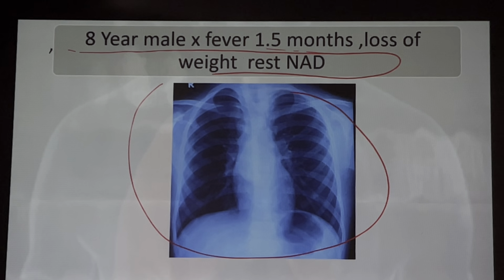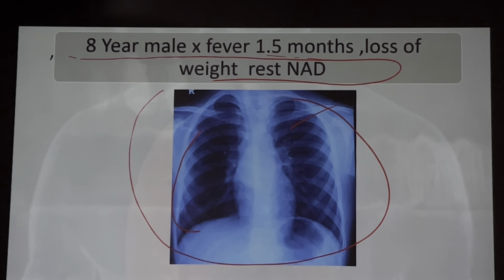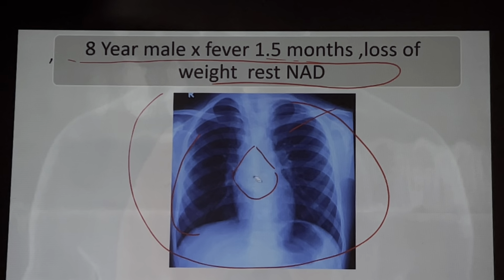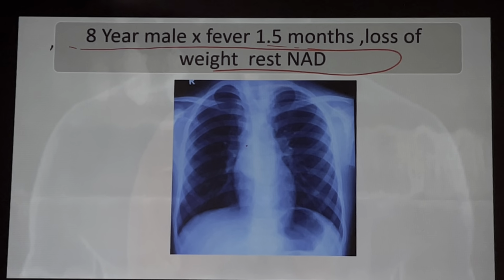On this X-ray, what I could see looks absolutely fine, except for some retrosternal area, retrocardiac area, and subcarinal. There is some radio-opaque rounded mass I could see here. I don't know whether that is visible there or not, but it is very visible on my screen. Following that, the patient was diagnosed to have tuberculosis by biopsy, and ultimately ATT was given.